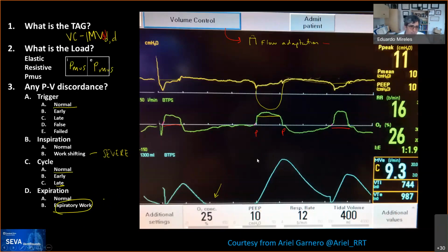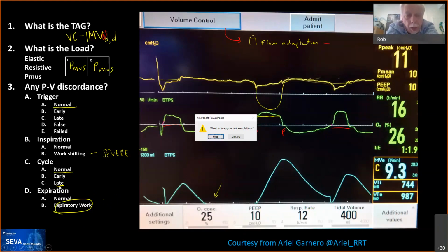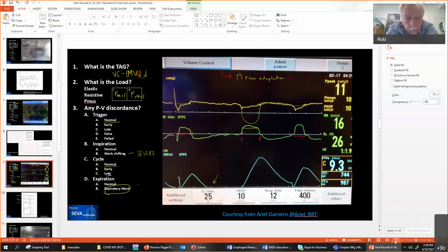Comment, Rob? Well, just one thing, it's important to understand dual targeting, because if a clinician puts a patient in volume control and therefore expects to have control over the tidal volume dosage, they won't. As you can see here, the tidal volume's all over the map. And it's probably excessive, certainly for the second breath, right? Yep.